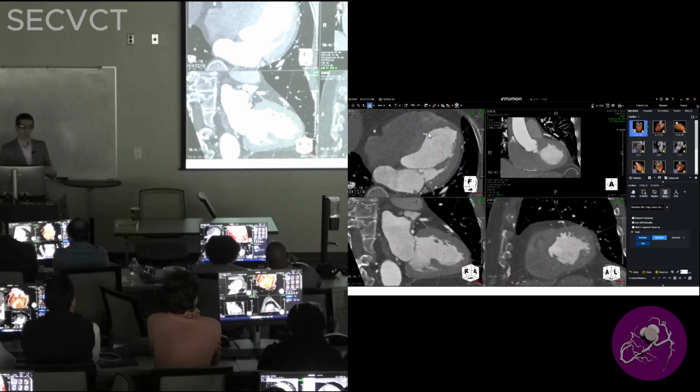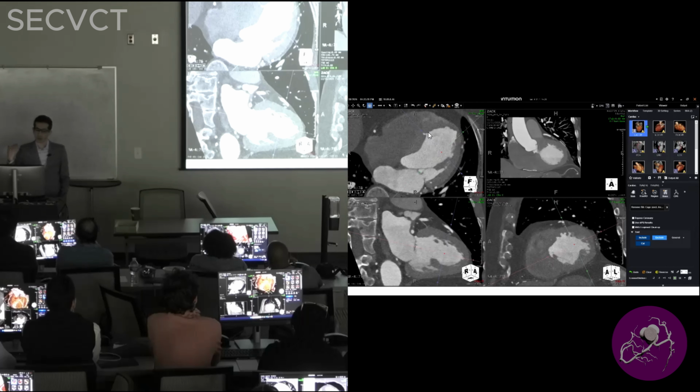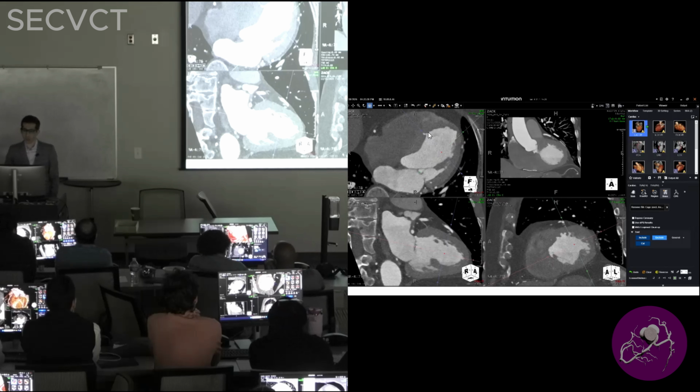What the significance of it, we see it also on MRI. I've done some screening MRI for individuals with family history of HCM with sudden cardiac arrest, and they're more aggressive. Even the echo doesn't stop like the screening. So we do MRI. So sometimes in the absence of well-defined HCM based on the criteria, but strong family history, I think this could be a kind of manifestation of early HCM. But in general population with no HCM, no family history, it's just some incidental finding. It doesn't mean much, but this is a cleft, so good job.